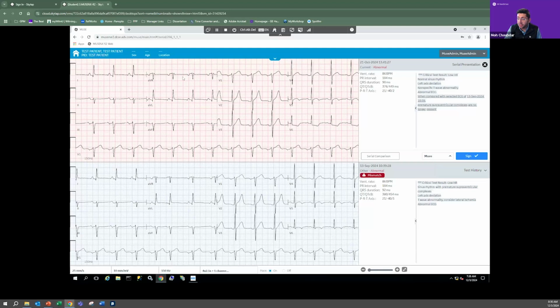It will go the same here. If you go in and change the patient demographics up top in a web client, in a thick client, then it still will not impact what you have in the serial comparison. Now, I'm guessing you're saying if you put a wrong patient information, you compared it to a previous ECG from a wrong patient, you realized, okay, this patient information is wrong. I'm going to go in and put the correct patient ID. I'm going to correct the information. And then hit demo complete or hit update, whatever you do in your workflow, still we do not have automatic serial comparison.